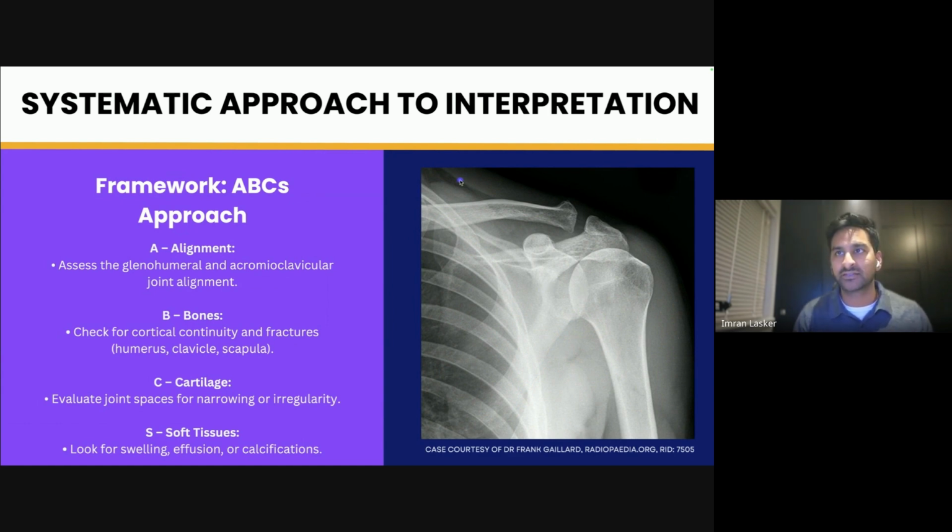And soft tissues, like I said, let's say this is going to be your trapezius muscle. If it suddenly looks really bulgy, then you know something's up. If you see something bulging up like this, you know something's up. So it's important to try and identify what soft tissue looks like, and does everything look nicely aligned with soft tissue.